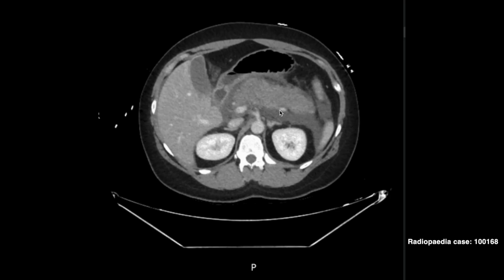Yes, the gland is lighting up. Bright, uniform, homogeneous enhancement throughout. That's living pancreatic tissue. And this is the key point. On portal venous phase scan, a normally enhancing pancreas means no necrosis. You don't need an arterial phase to make that call in most cases. The portal venous phase gives you the perfusion information you need.